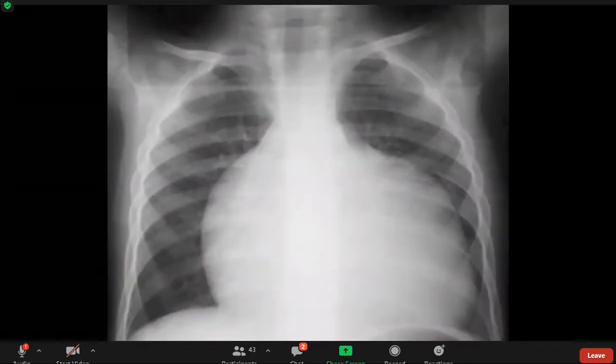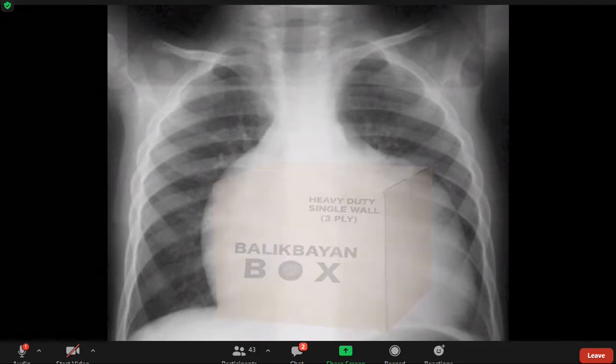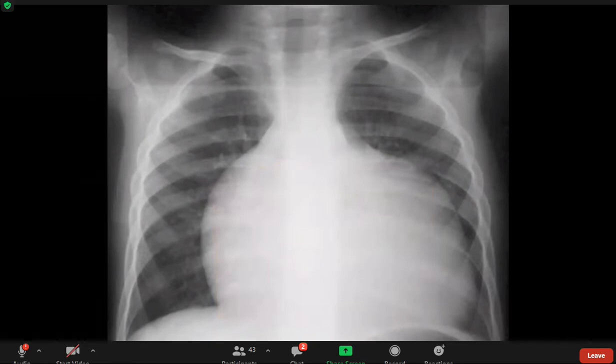So this is the classic image in a radiograph in a pediatric patient. Usually this is associated with the box-shaped heart sign for reference. However, it's important to know that not all patients present with this. Usually, it will depend on the degree of dysplasia and the degree of the right heart dysfunction as well. So usually, patients with less marked valve displacement and tricuspid insufficiency can only have mild right heart enlargement. So this is not seen in all cases.